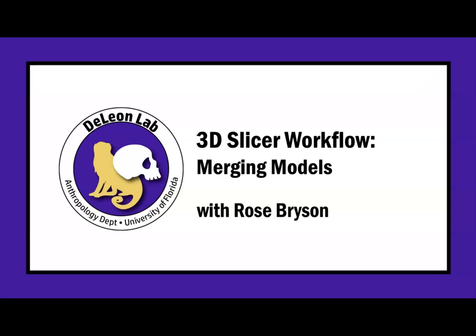Today's tutorial will cover how to merge multiple models into one combined file in 3D Slicer. So if you haven't created your 3D model in Slicer yet, I've linked in the upper right-hand corner some tutorials from our lab that'll help you do that.